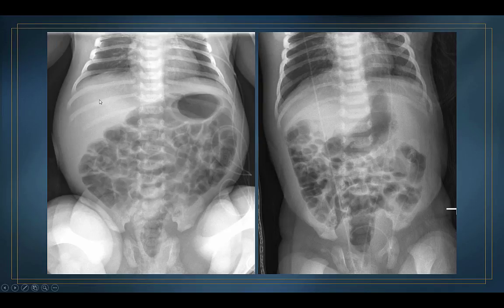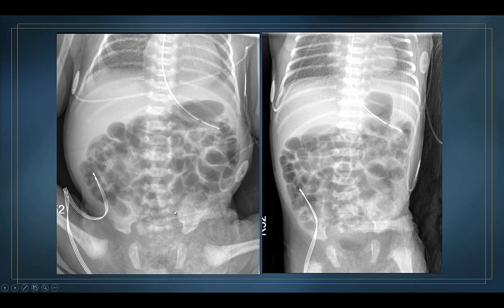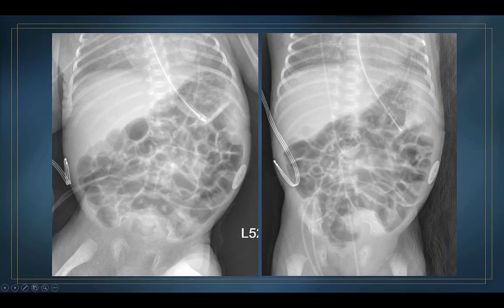Maybe a little bit more distended. The decube is really unimpressive. This is going to be colon, rectum. Maybe a little bit worse, but this is maybe a little bit more equivocal. Here's a loop that's slightly elongated, so I wouldn't argue if someone asked for a follow-up on this, but to me it's relatively nonspecific distension. You'll get a better idea of what's asymmetric distension when I start showing you the babies that do have NEC or do have a distal intestinal obstruction.